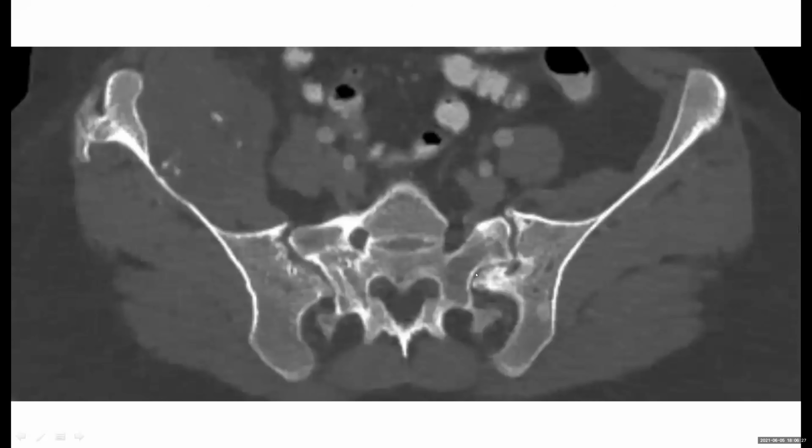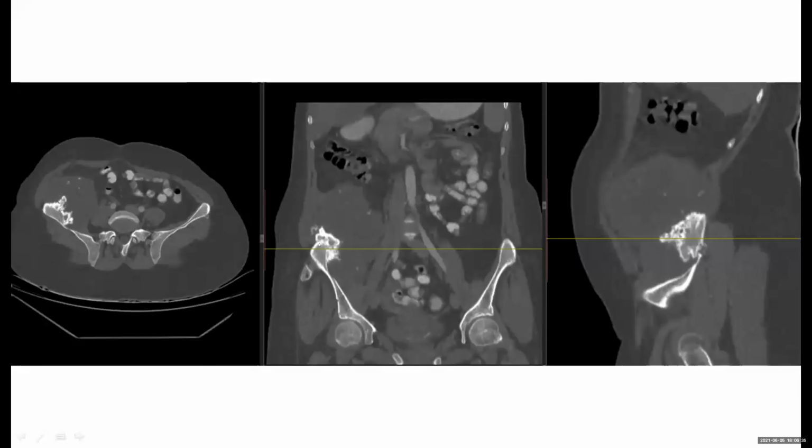So this was osteochondromas, which you can see. This is one osteochondroma, this is second osteochondroma. So this was chondrosarcoma. There was a malignant degeneration of an osteochondroma. So multiple osteochondromas, diaphyseal aclasis. Okay, ma'am.